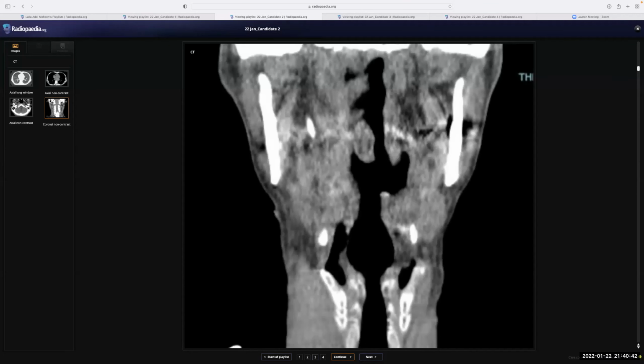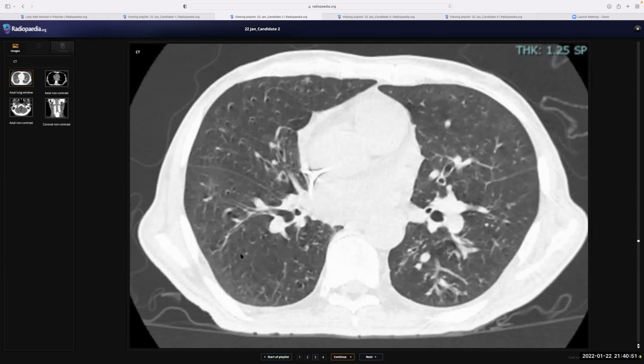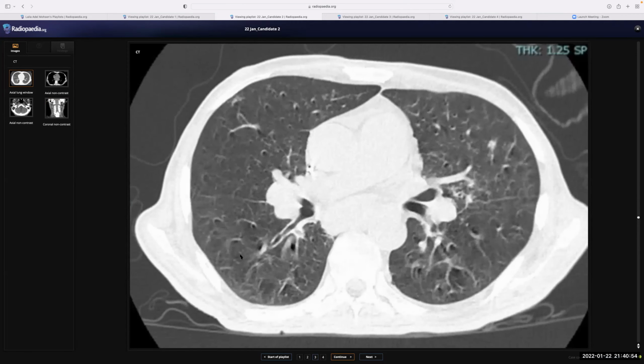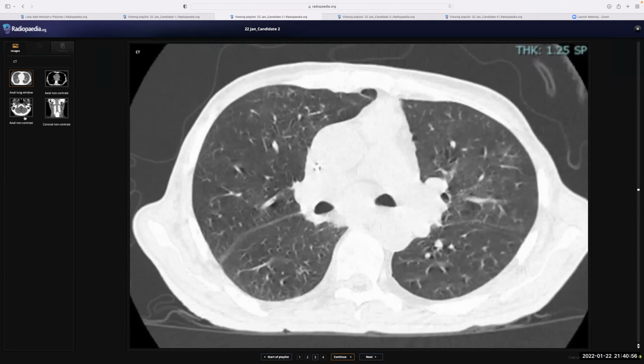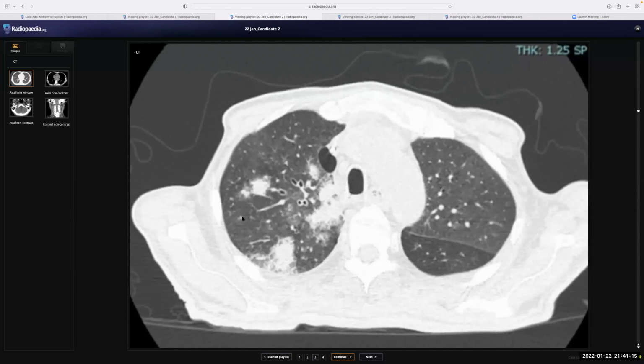In short, this is a 60-year-old male patient with a central venous catheter with cavitating lung nodules, some areas of miliary nodules and tree-in-bud, and a suspicious lesion in the nasopharynx. The patient has a history of being treated for a carcinoma. So in my opinion, putting all these things together, this patient most likely has nasopharyngeal carcinoma, which is notorious for causing cavitating metastases in the lungs. And for that, this patient is having his chemotherapy.